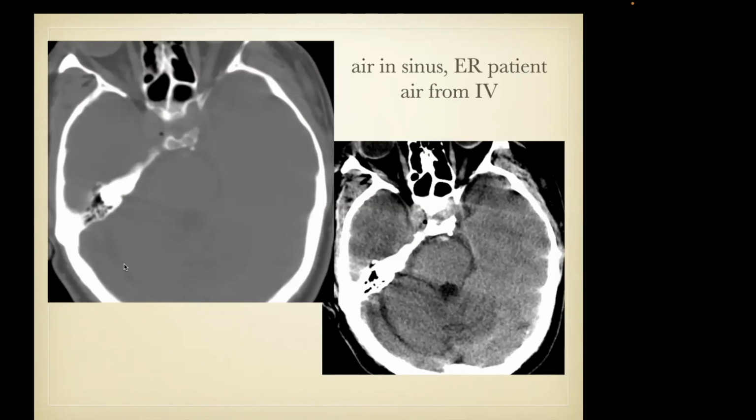This is very common in patients who come to the ER. We see it in patients that have been emergently transported with rapid administration of intravenous fluid, often multiple bags of fluid, and the air that is oftentimes in the line and not fully cleared when you're dealing with an intravenous injection. It will often reflux up into the cerebral circulation and cause no end of confusion if you're not aware of this.